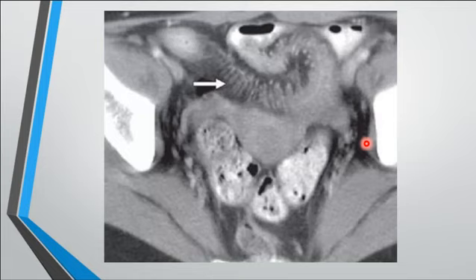It's hypervascularity and engorgement of the vasa recta. The vasa recta becomes hypervascular and engorged. What's the DDX? Like Crohn's disease, lupus mesenteric vasculitis, infectious colitis. Okay. It can be used to differentiate active inflammatory conditions from lymphoma and metastasis. Lymphoma and metastasis are hypovascular, while active inflammatory conditions will cause hypervascularity. The vasa recta will be engorged and prominent, whereas in lymphoma the vessels are less prominent. Okay?